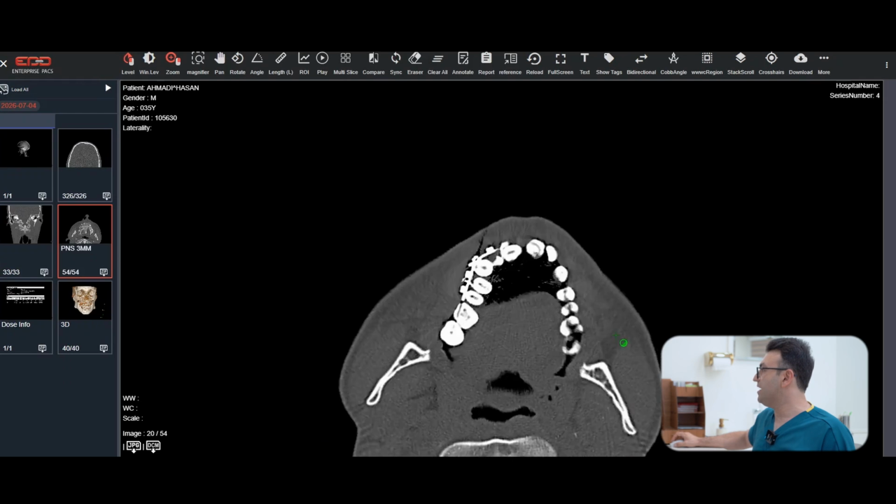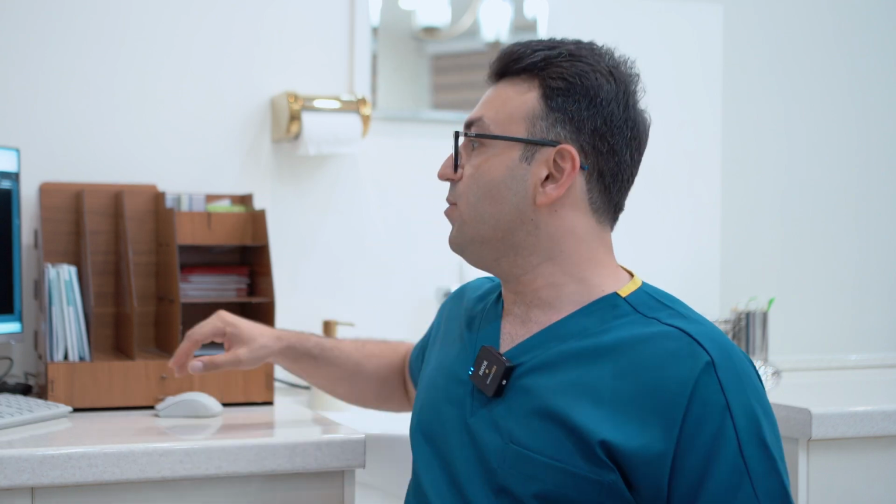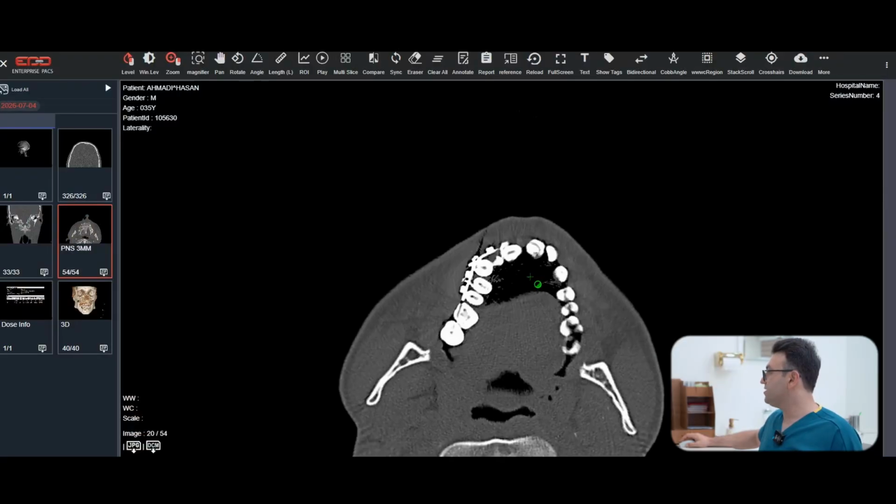And again, I go back and start the evaluation of the maxilla. For the maxilla, I check the dentoalveolar fractures. Also, I check for the Le Fort lines, and also the buttresses of the zygoma. So I start here, with the maxilla.